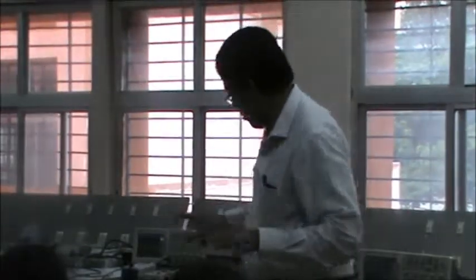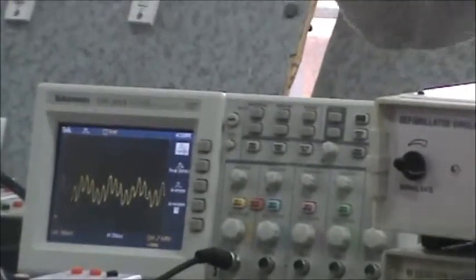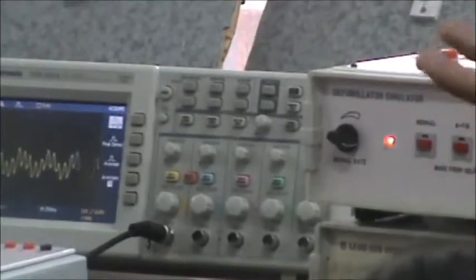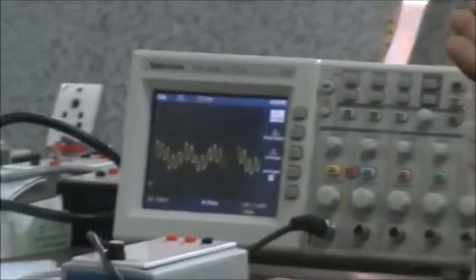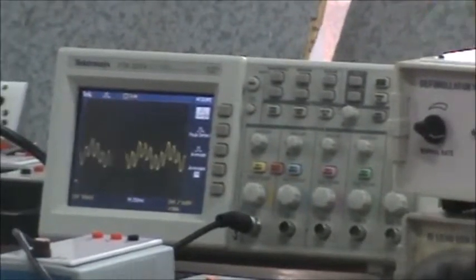Whereas in ventricular fibrillation, you just deliver a certain amount of energy, and if it is still not revived, you increase it. So you escalate the energy. Nowadays you have automatic external defibrillators, which we call AEDs.